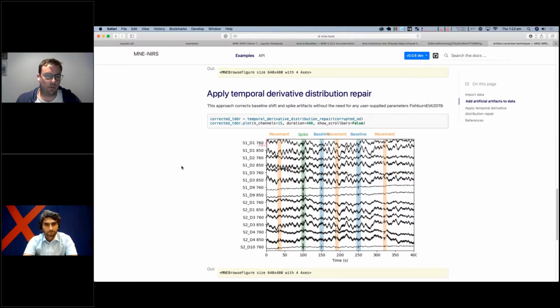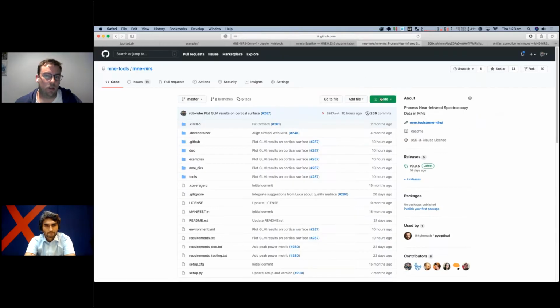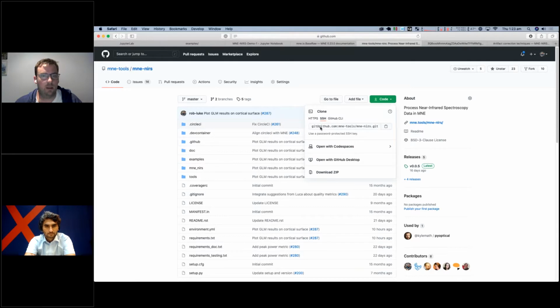We do releases approximately every 6 months. I'll chase up when the next one is, because it would be handy if people could do it. If you want to install the cutting edge version, which is no problem, you can do that. You can type pip install mne, and that will install the stable version. But if you go pip install and you provide the git address, so you paste this address here, it will give you the newest version, and that will allow you to read the data.